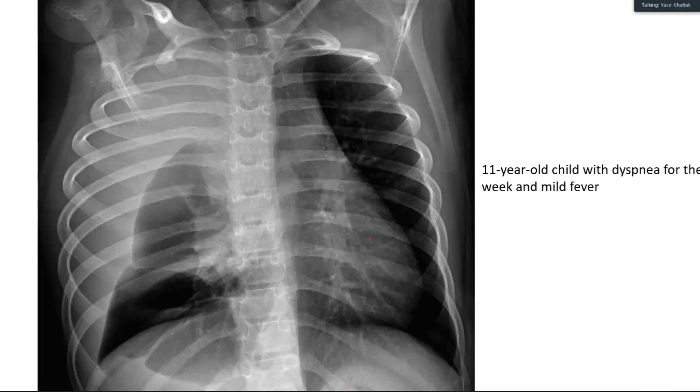So what else would you like to do? Immediately for this patient I would do chest tube insertion because of mediastinal shift. The patient has mild dyspnea. So you would like to intubate this patient? Yes, sir. There's mediastinal shift, so intubation would be done. Right. Then I would further evaluate the patient on CT with contrast. Okay, the patient has dyspnea, but the patient is not desaturating.